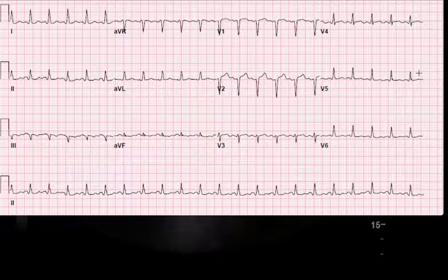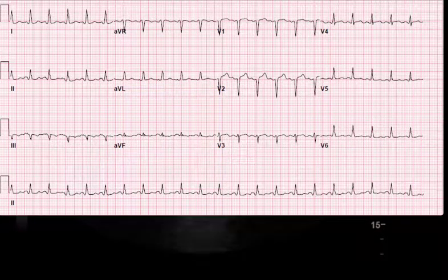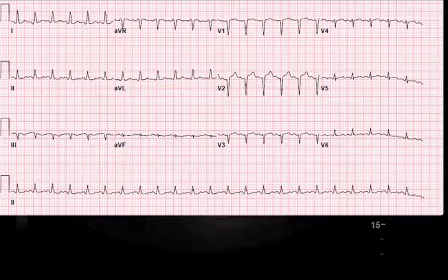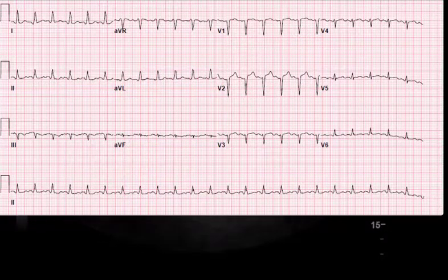Patient was examined and this EKG was done. A repeat was done pretty much 10 minutes later, and based on the ST changes in V2 with the poor R wave progression, the ER doctor felt it was best to activate the Cath lab. However, when the cardiologist looked at both EKGs and heard the presentation, the cardiologist wasn't convinced enough to continue the activation, so requested that the Cath lab not be activated.